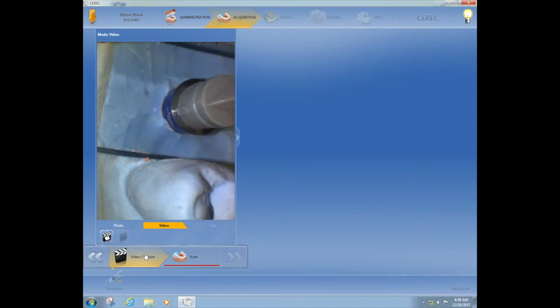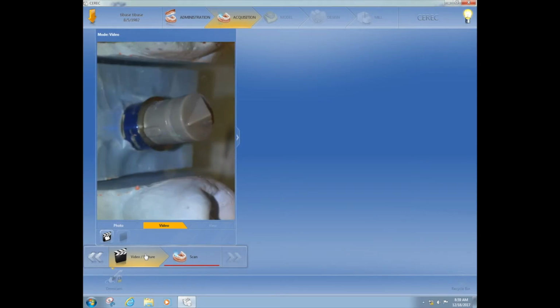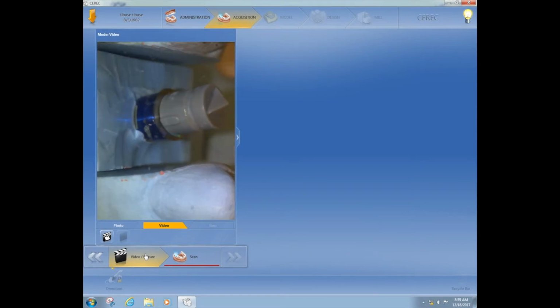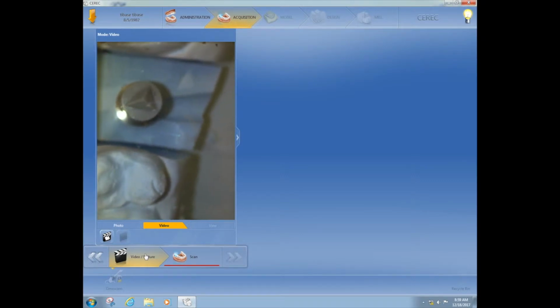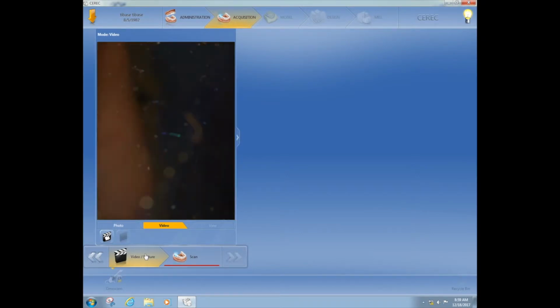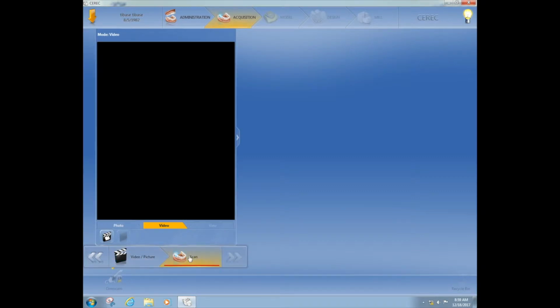You can kind of see now that little bleb or push out is where that has married up with the TiBase, and it's fully seated. You just push down with your finger and make sure it's seated. In the mouth, you may have to use a hemostat to make sure it's fully seated. Suggestion is you can also mark that little outcropping with a marker, like a Sharpie. But once that's on, you can go ahead and scan it.